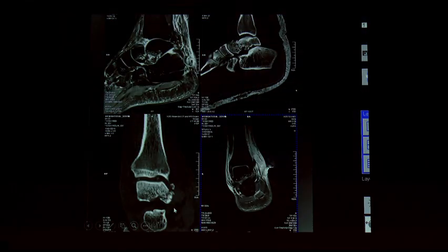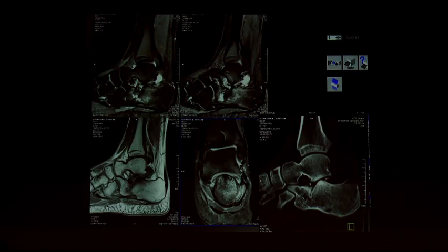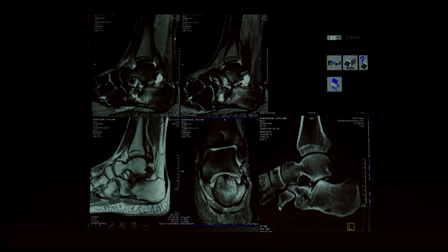Whenever there is a fracture, you can see the talar fracture completely obliterating the sinus tarsi. You can see the bright signal is replaced by low signal areas, complete obliteration of the sinus tarsi. Classical cause of talar fracture presenting as sinus tarsi syndrome. Here, in the calcaneal fracture, you can see the fracture completely obliterating the sinus tarsi. So sinus tarsi syndrome is commonly associated with fractures of either the talus or calcaneum.